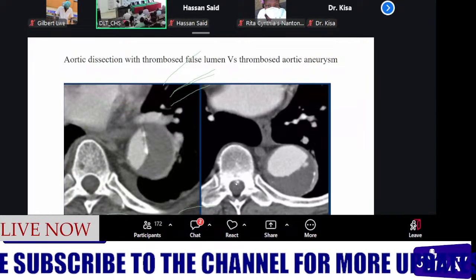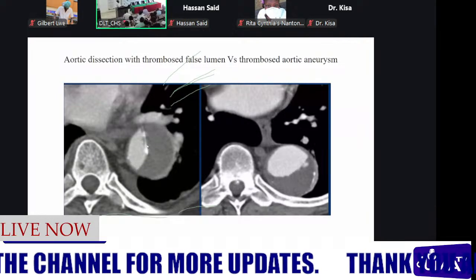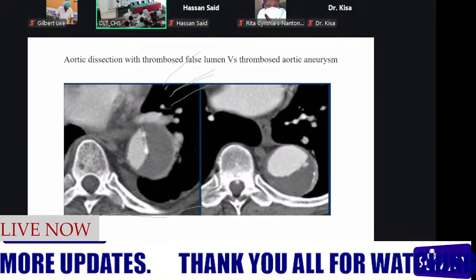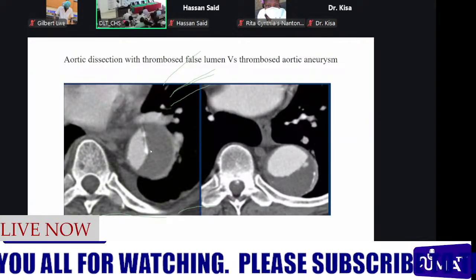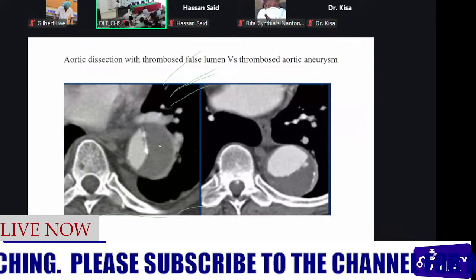So they are both a contrasted image, and we are at the level of the descending thoracic aorta. So we are seeing our lumen, which is well opacified. This is an aortic dissection. Then on this side, we have a thrombosed aneurysm. They are both thrombosed. So for the aortic dissection, like we said, we look at the calcification.